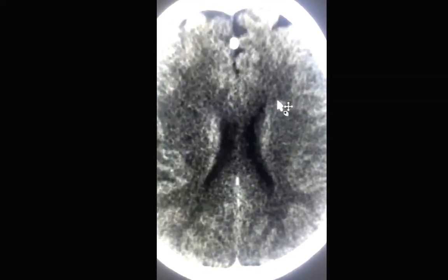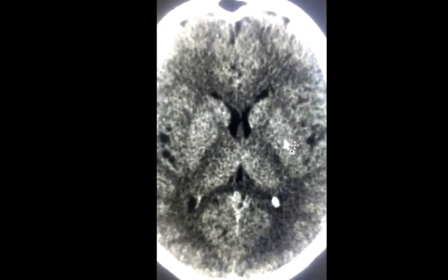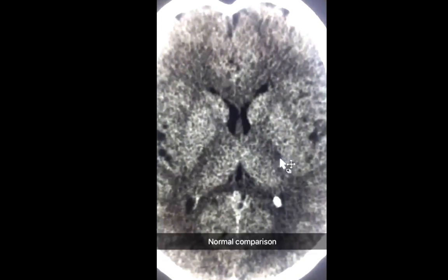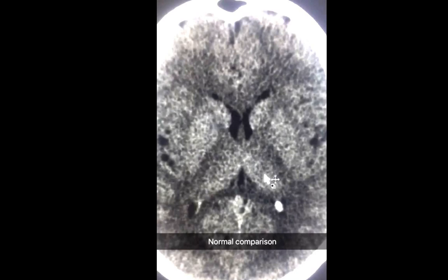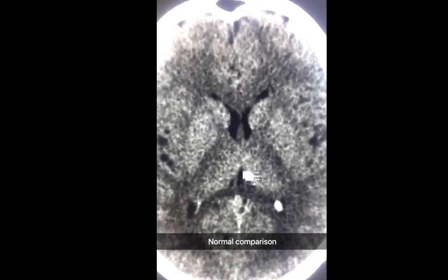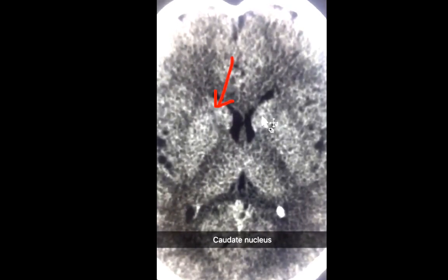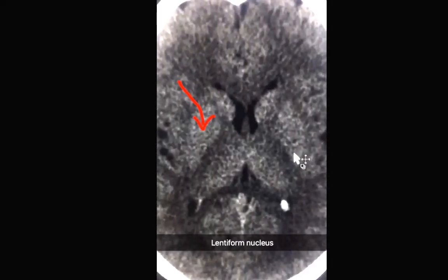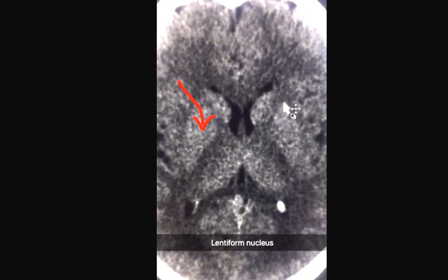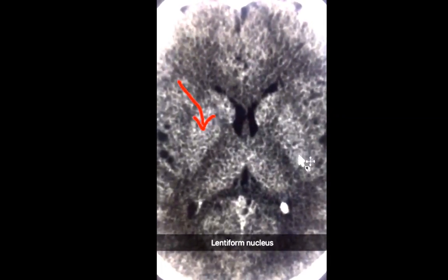The more bright gray matter could either be superficial, such as the cortex, or deep, such as these structures here. What we want to concentrate on today for the sake of the discussion case would be those deep gray matter structures. So from anterior to posterior, the first thing you'd see is this nucleus here of gray matter. This is called the caudate nucleus. Lateral to that and more posteriorly, you'd see this larger nucleus, which is called the lentiform nucleus.